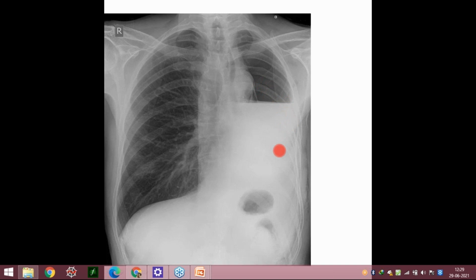So coming to one point that I wanted to put forward for you guys: in clinical scenarios, many of you may opt for medicine in future. When you see a case of hydropneumothorax, one soft marker of telling whether it is fluid or it is pus is if you are able to see the ribs. See, in this opacified region, if you're able to see the ribs, you're likely dealing with a hydropneumothorax.